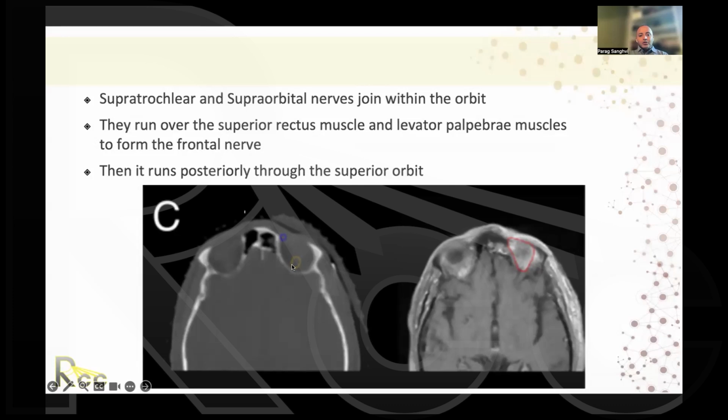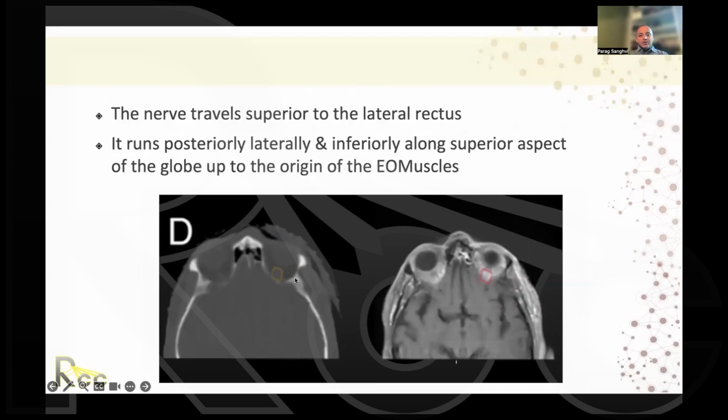And then I'm going to contour. So you can see here's the optic nerve. You're really going to cover a lot of that retrobulbar fat space, as you can see. So again, showing you that nerve path right here. And this is just showing you the musculature of the orbit, kind of just showing you anatomically where it's going to be.